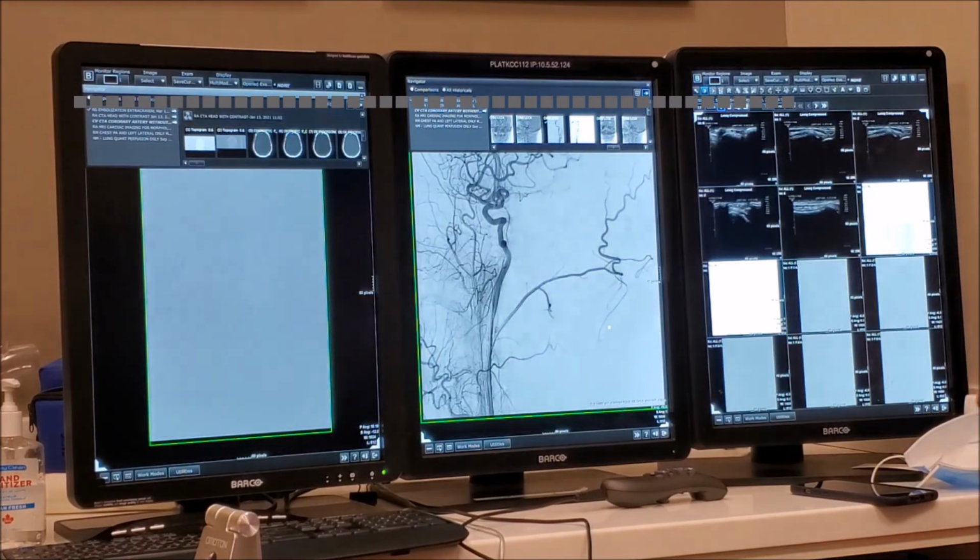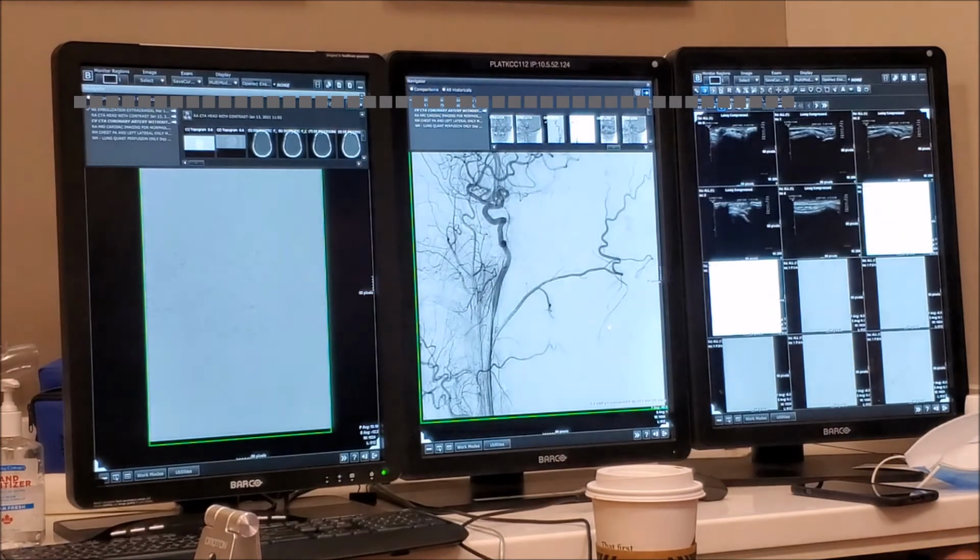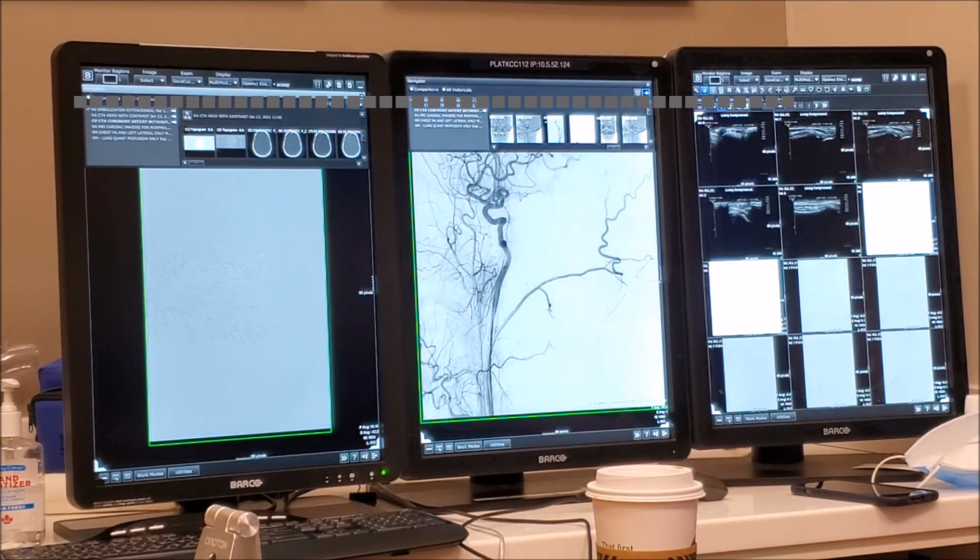It's off the occipital. In the occipital, we want to find arteries that are cutaneous and arteries that go through the bone and supply the meninges, like a dural AVM, something like that. How do you differentiate it? What do you think this one is? Is this superficial, skin, or is it meningeal, bone? I think it's skin just because of the tortuosity of the vessel appearance. Okay. It does come in around the muscle somehow here, whereas this one is more of a meningeal artery.